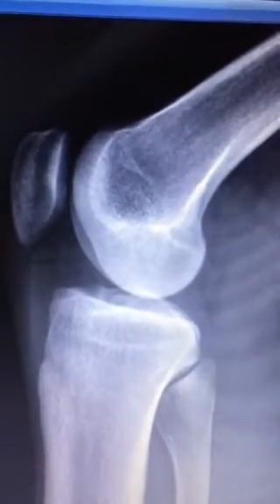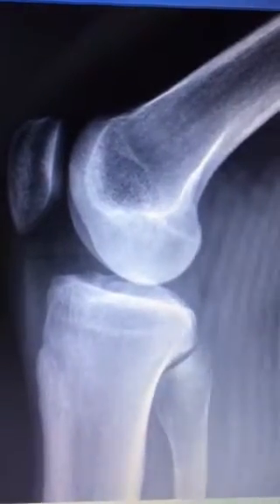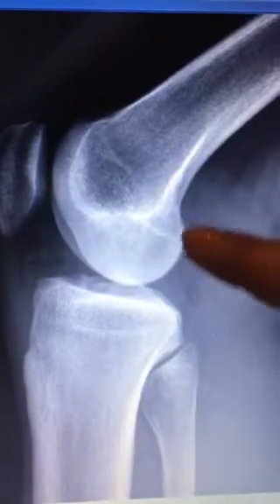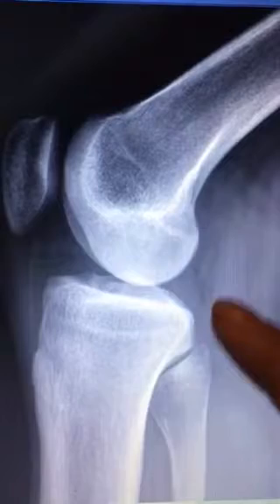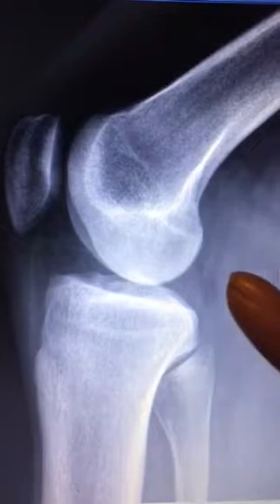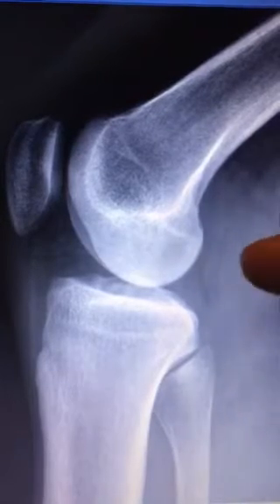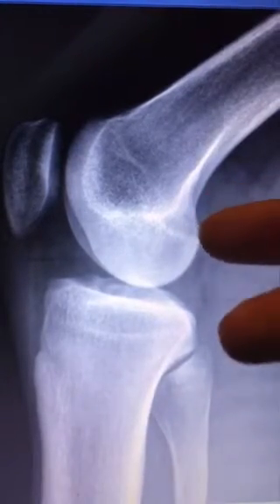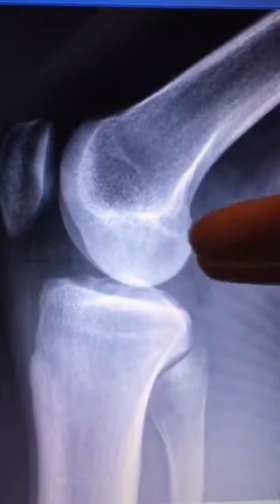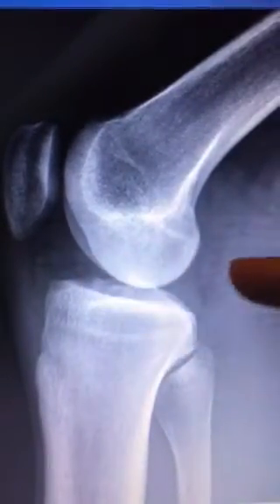The next one is my lateral view. For the lateral view, we should see the femoral condyles superimposed. To get superimposed condyles, we need our central ray angled cephalic about 5 to 7 degrees, because the medial condyle is a little lower than the lateral side, so that's why we angle the beam, to have a little more superimposition and opening of the joint.